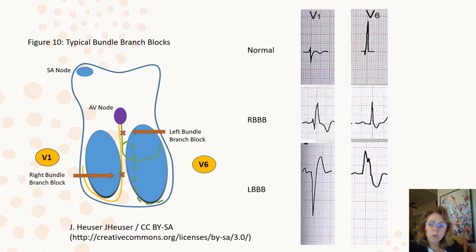If you look back at the slides at the EKG, I'm not sure I can do that with a recorded PowerPoint. In class, I would go back to one of the 12 lead EKGs that we have looked at. What we see is that V1 in a normal EKG always starts off being negative. Then if you remember V1, V2, V3, V4, V5, V6, you can actually see a transition of that complex going from primarily negative to positive.